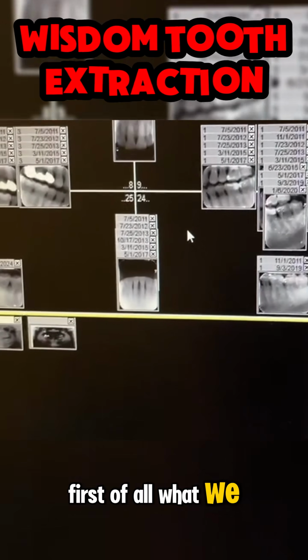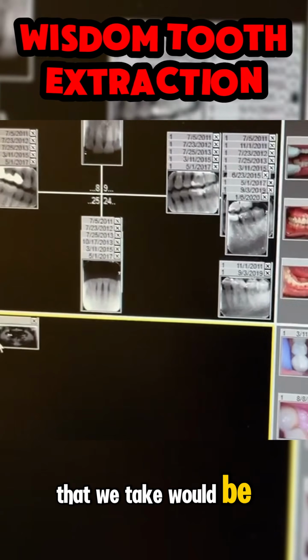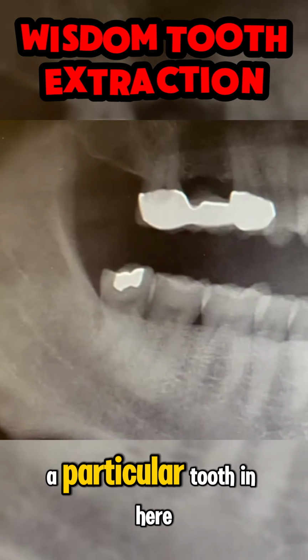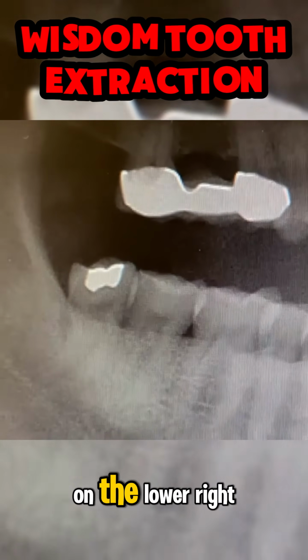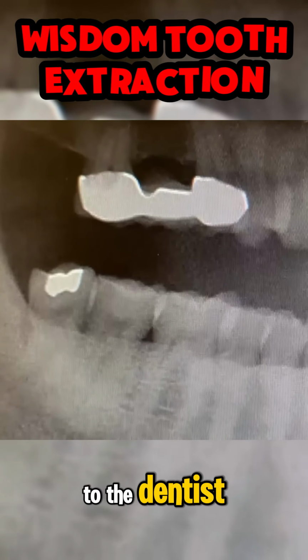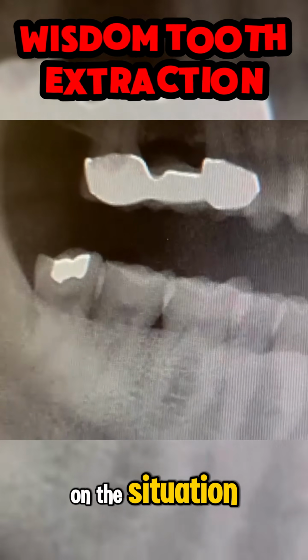Now, first of all, what we have to do is make sure that we are taking an x-ray. One of the x-rays that we take would be what we call a Panorex. A Panorex looks like this, and we are looking at a particular tooth in here, which is the third molar on the lower right, which is what we call number 32 when you go to the dentist. Lower right third molar is the complaint that the patient has in this situation.